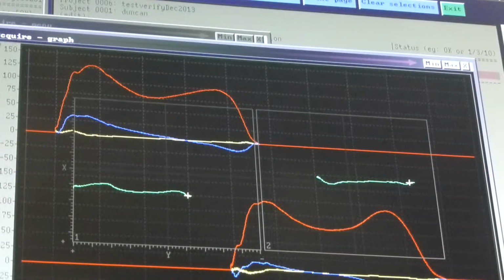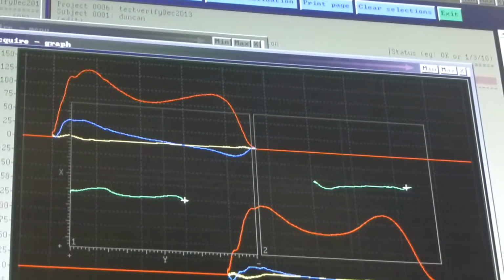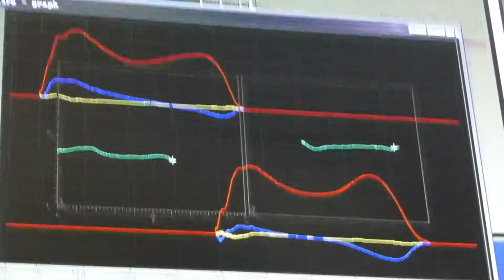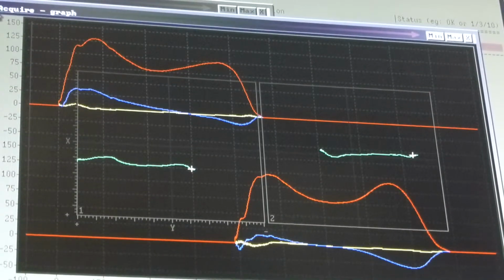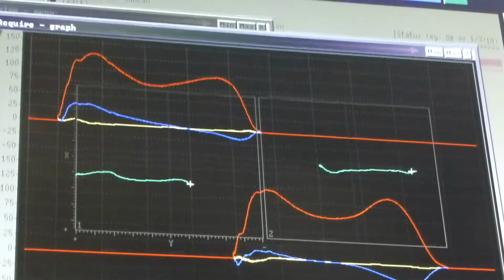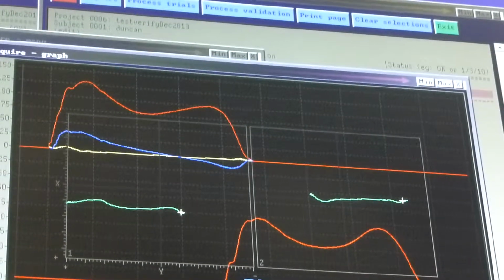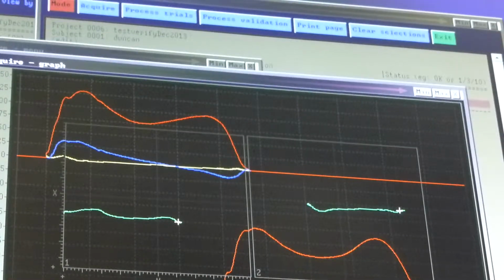Is that first hit to lift off, or what it's plotting is the exact point on the force plate that was pressed on as that strike progresses. Now, in the case of a human, you've got a human subject. It's a pretty long line, and that's why if you imagine striking on your heel and kind of rolling across to the toe, it's showing you all the points that were struck as it went from one to the other. In the case of the dog, it's more just a little clump of points all almost together. Okay.